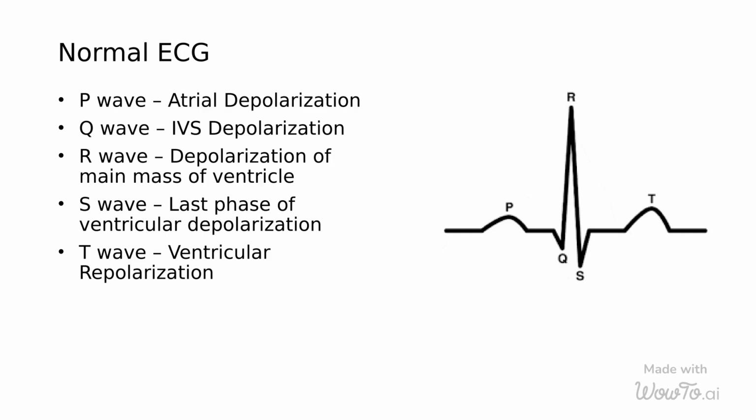The S wave indicates the final phase of ventricular depolarization. It follows the R wave and completes the process of ventricular contraction.